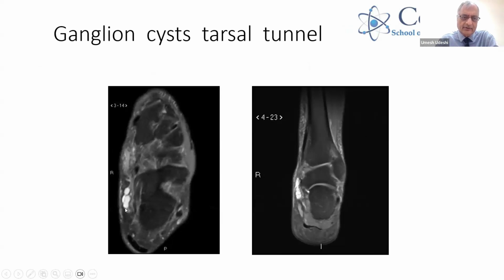And this is in the tarsal tunnel. It's deep to the flexor retinaculum and superficial to the talus and calcaneum, these cysts. So the tibial nerve goes through that area and its branches, and you can get pain because of nerve impingement.